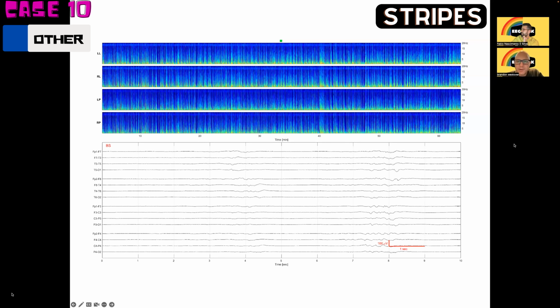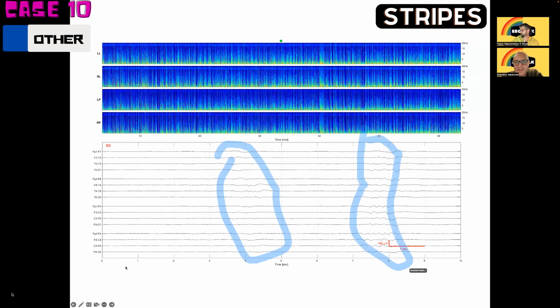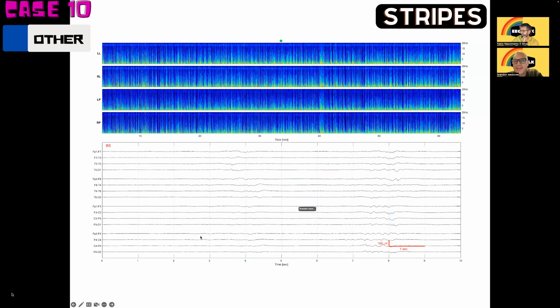Actually, for our readers, do we want to circle the bursts? Oh, yes. I think you can see them. So burst here, kind of asynchronous, and then a little asynchronous. There's the bursts. Then these are the suppressions. Nice. This drawing is not the best, but cool.